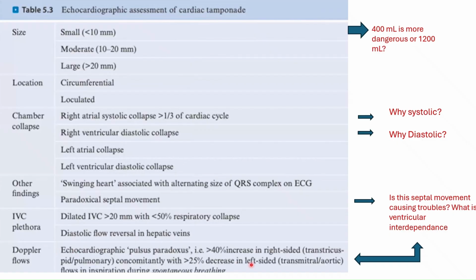So if you put pulse wave Doppler on the mitral valve or on the tricuspid valve, we should see respirophasic variation. So we should see the filling going up at some point, which is going to be expiration, and then the filling going down during inspiration, and vice versa, right? And the mitral, if you see the opposite side of the heart. And let's go and check that on the next slide.